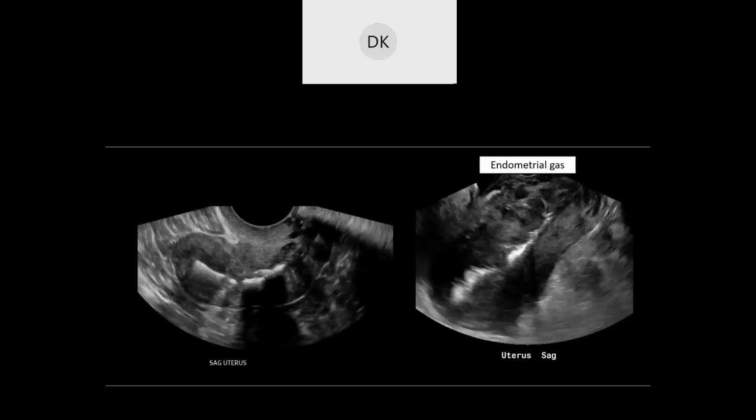Here's a companion case with an echogenic endometrium. Is this also gas? Well, look here on this case, and we see dense posterior acoustic shadowing instead of this dirty shadowing here. So that's telling you more that this is calcification. And just like with that Staghorn calculus, look at the anterior margin of these echogenic areas. They're very sharply defined, more like a solid structure, like calcification, whereas the gas here is very irregular and ill-defined, often linear and curvilinear. And this is just endometrial calcification.